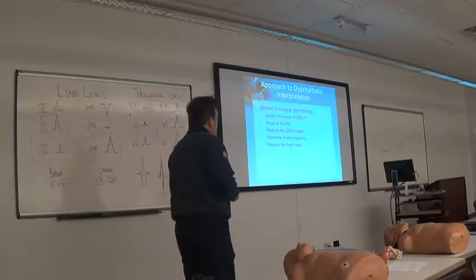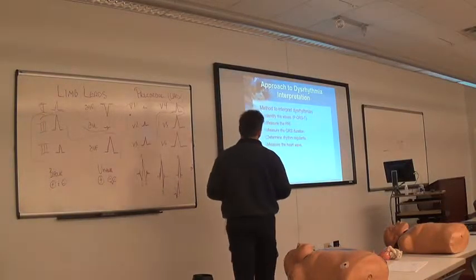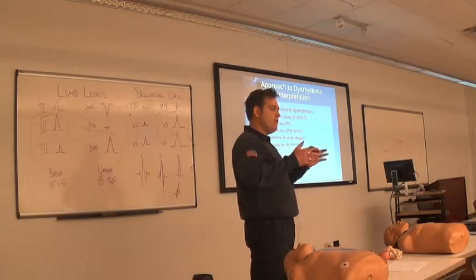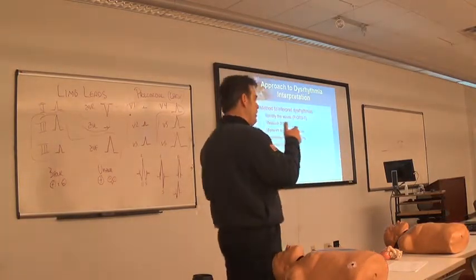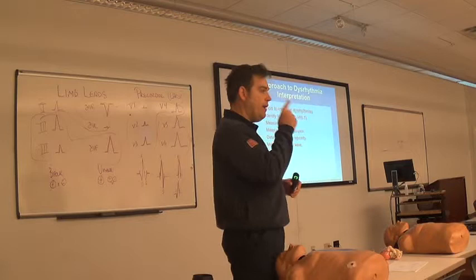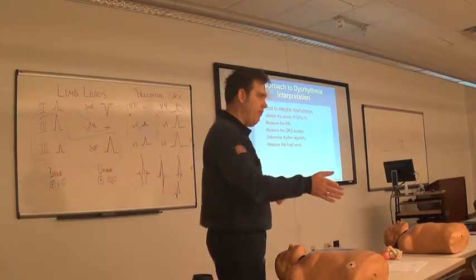All right. So when we read an EKG, here's what we need to do. We need to identify the waves. The first rule to rhythm interpretation is I want to know, is it sinus? Period. Always look for the P waves. Number one thing when I look at any EKG is I'm looking for P waves. If I see the presence of P waves, and there's only one P wave to each QRS, it is sinus. Period. P wave equals sinus. Say it. P wave equals sinus.